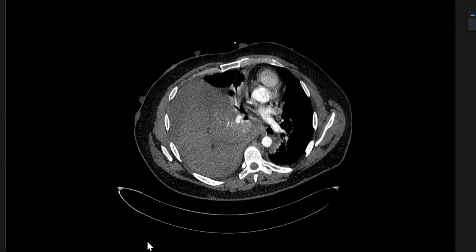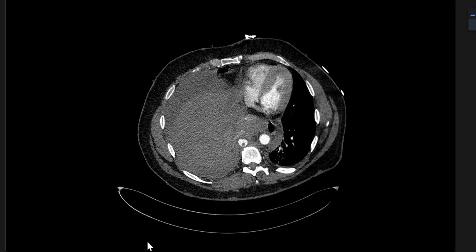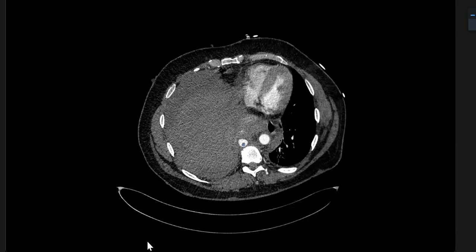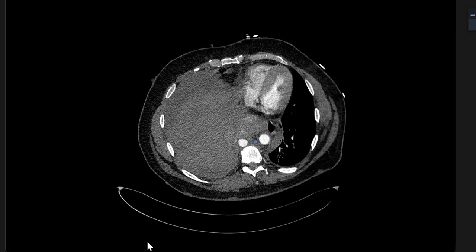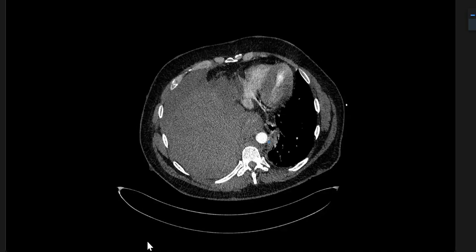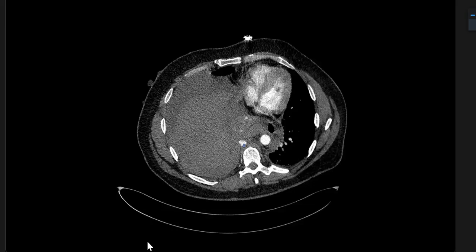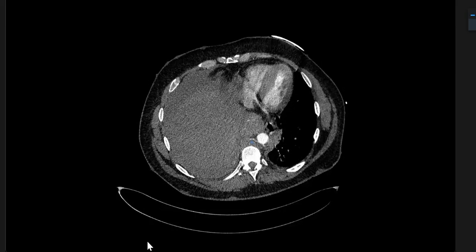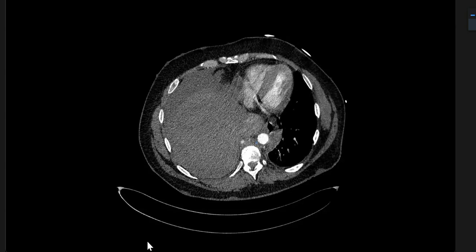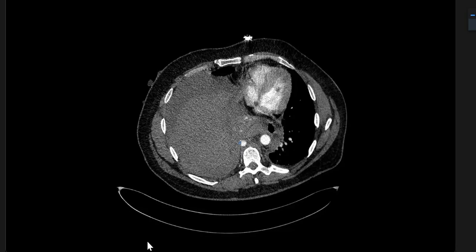And what's that? And then what is this? You went past it quite a few times actually. What is this? This is an aneurysm, pseudoaneurysm. See, it looks like aorta. Is it double aorta sign or what? So this is the main aorta. And then if you see, this is just like aorta. And if you are mindful, there's an artery coming off here and feeding this pseudoaneurysm. So basically it's bleeding from an intercostal artery into the pleural space.